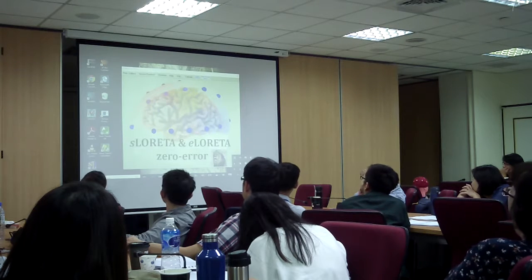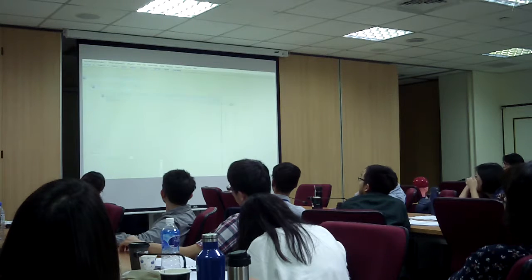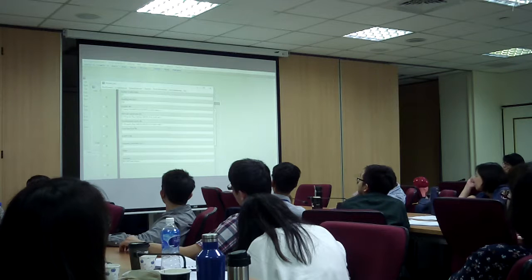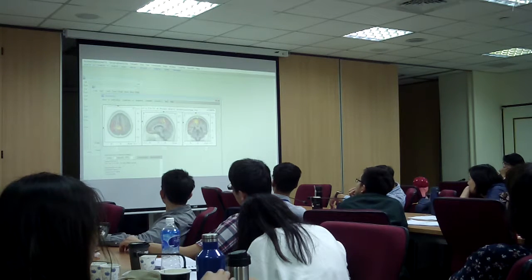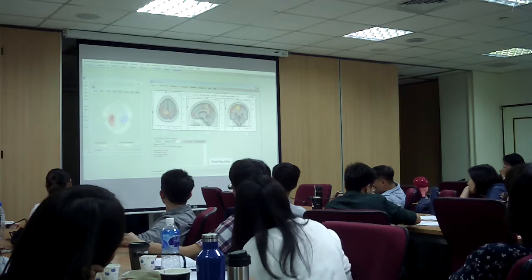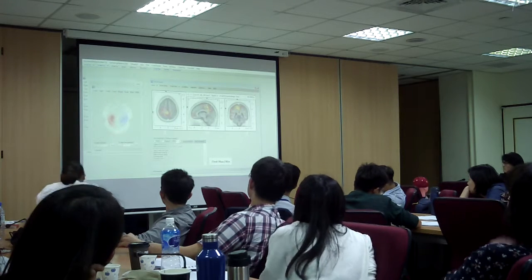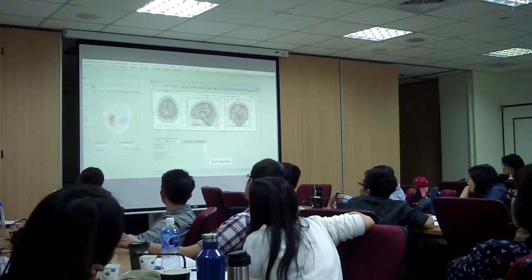So I'm going to go Viewer Explorer, and I'm going to open this up. I'm going to go Jobs, Load Selected, and I'm going to go Yes. All right, so here we're going to have some additional Brodmann areas. That one was showing us a Brodmann area 42, but down here we got a Brodmann area 5, Brodmann area 7, and Brodmann area 31.